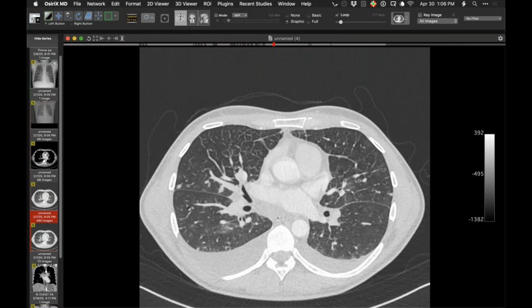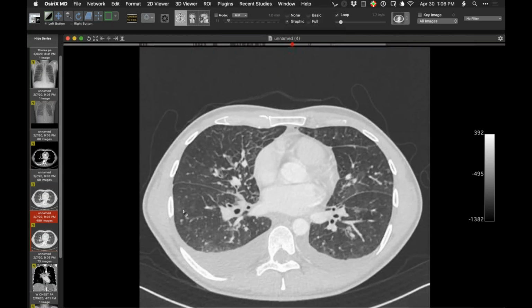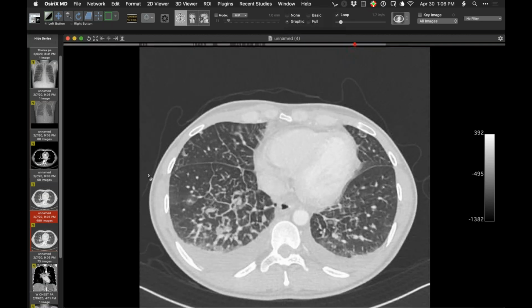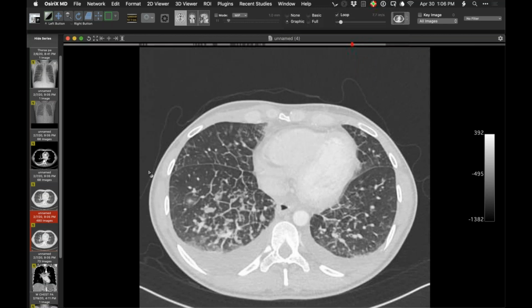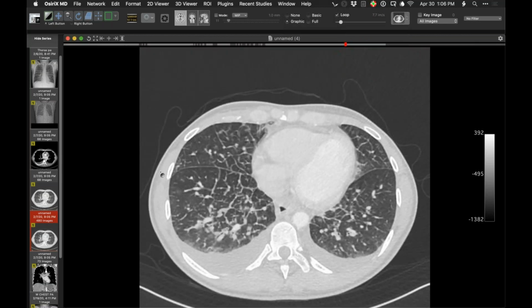And sometimes if you don't recognize that these are septal lakes of interstitial edema, one may potentially describe the lung edema, but also suggest that there's a separate pathologic process that's nodular lung disease when you see opacities like this. But it isn't. This is just very florid septal edema with septal lakes. Of course, we do see peribronchial fluid cuffs and pleural fluid. So florid interstitial edema with septal lakes.